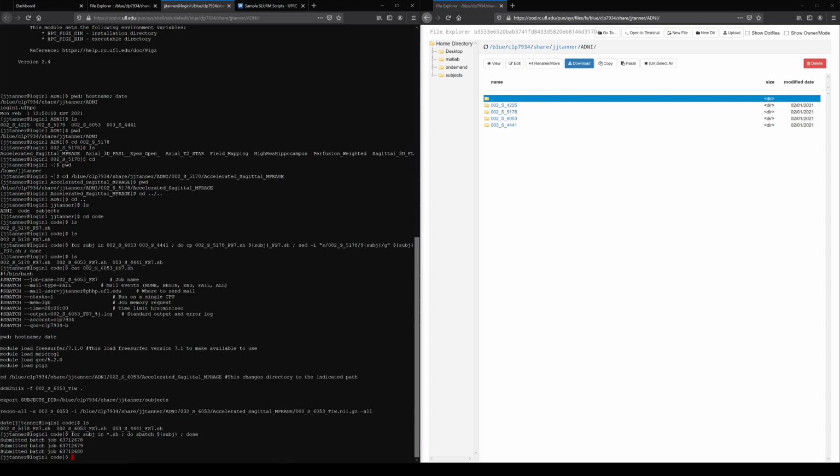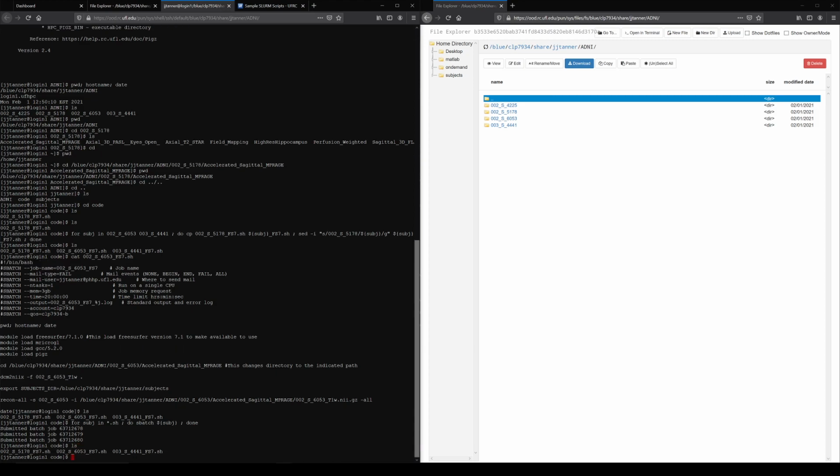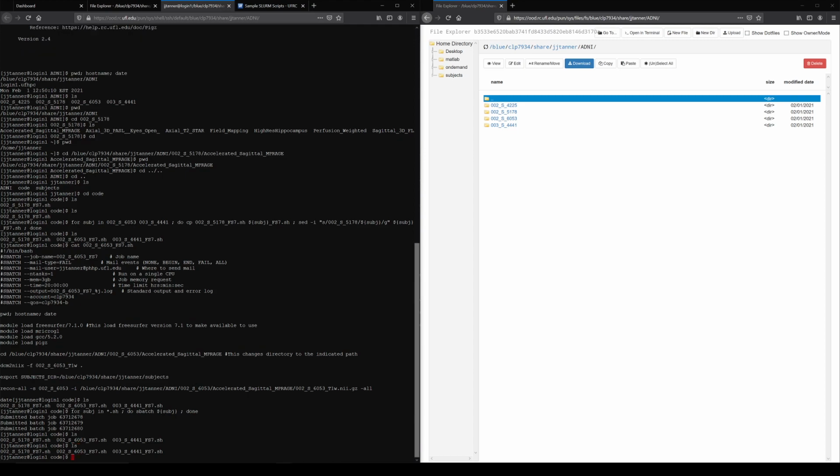So how do we know if it's running? There's different ways to look at it. And there should be an output log that's going to be saved within this directory that we submitted them from. That hasn't started yet. I don't see anything. It's because the jobs haven't started. So I had requested burst allocation, burst access, which means that submission, they kind of put it on hold a little bit. Sometimes it can be almost instantaneous, but the priority is lower.